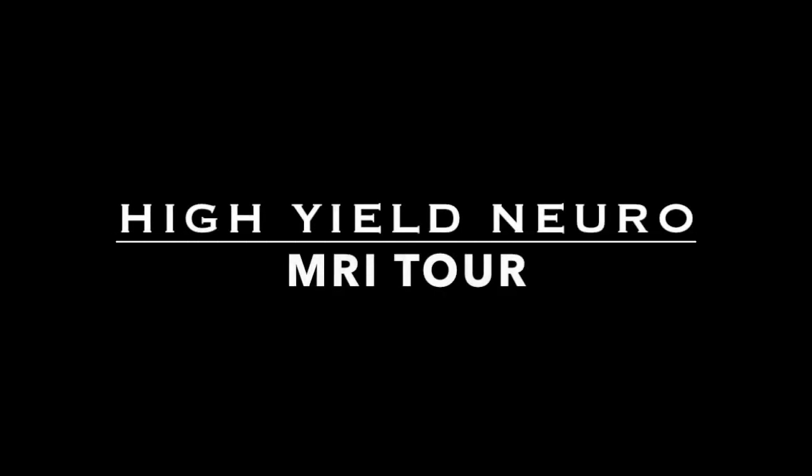In this series on high-yield neuro, we're going to be going through MR images of the brain in all different planes in order to identify major structures and go over some high-yield topics. So without further ado, grab some coffee, get comfortable, and let's get started.